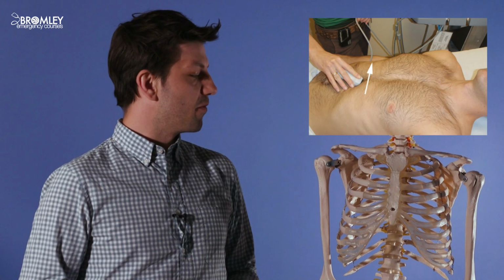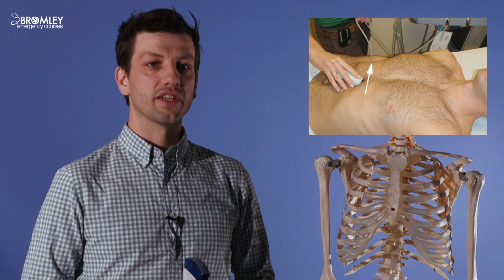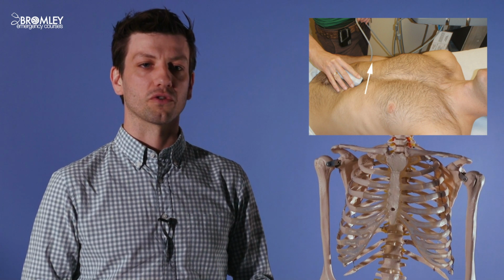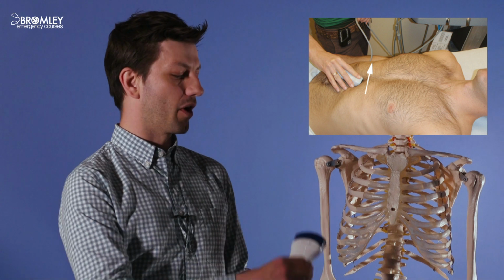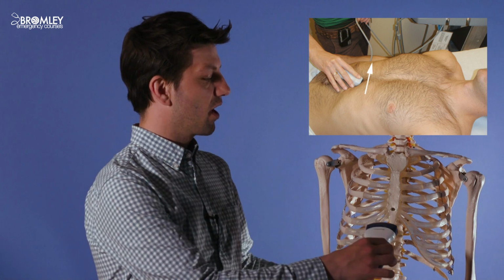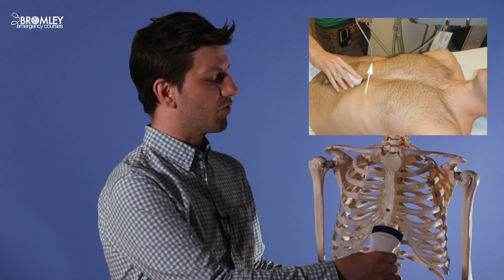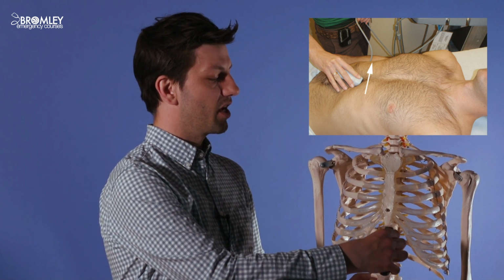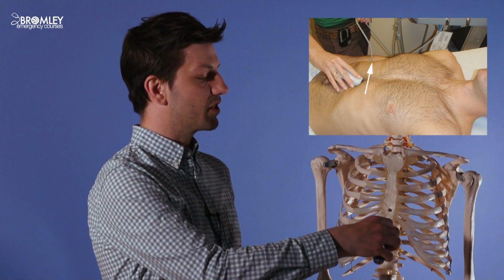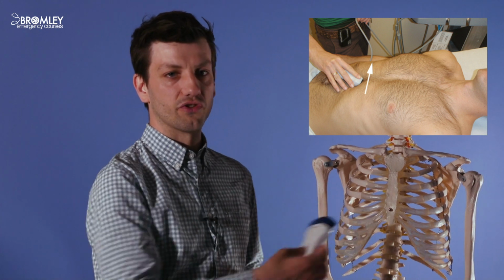So this slide acts as a reminder of how we obtain that view of the inferior vena cava. The easiest way to get to the inferior vena cava is to first start off by obtaining a subcostal echo window. So probe marking towards 3 o'clock, towards the patient's left hip, scan through the liver, and we obtain that subcostal window. At this point we can rotate the probe anti-clockwise until the probe marker is towards 12 o'clock or towards the patient's head. And what we'll see on the ultrasound machine is an image of the IVC as it exits the right atrium.